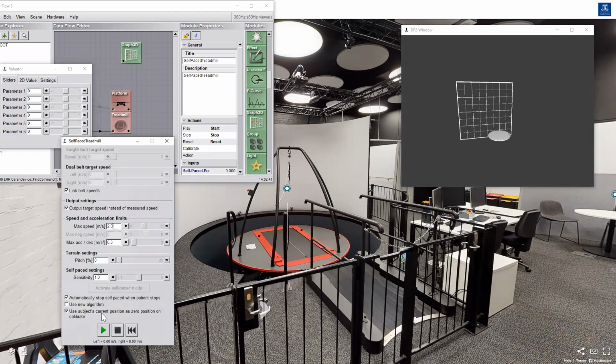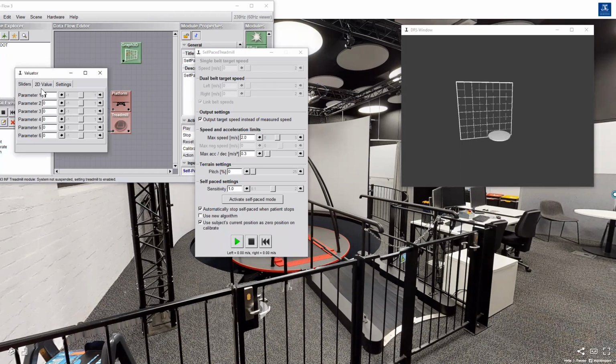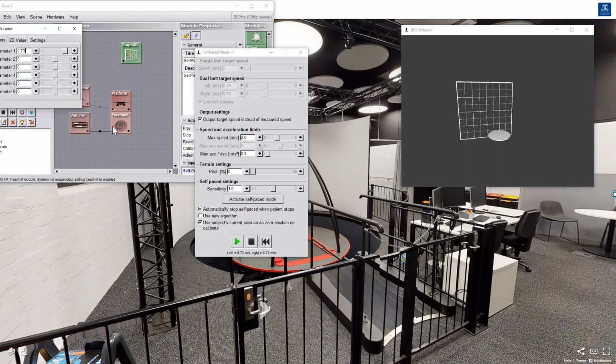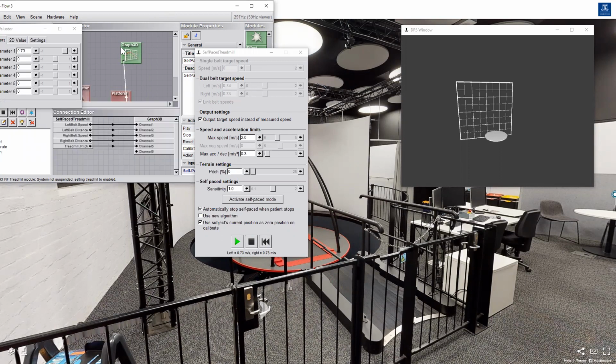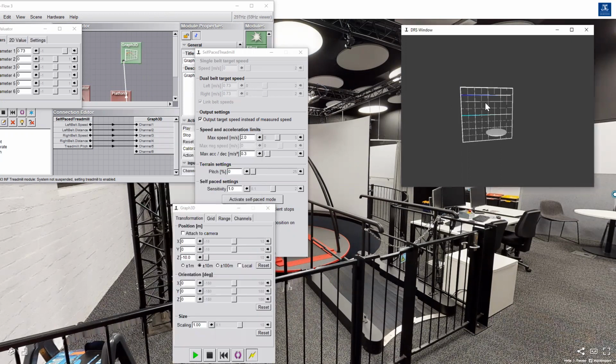And if you turn on your treadmill, and then you change it, this is 0, all right? You can see that this is changing, and I just wanted to give the endpoint of this to the treadmill, to the graph. And if you do that, you would see that the changes happen here.